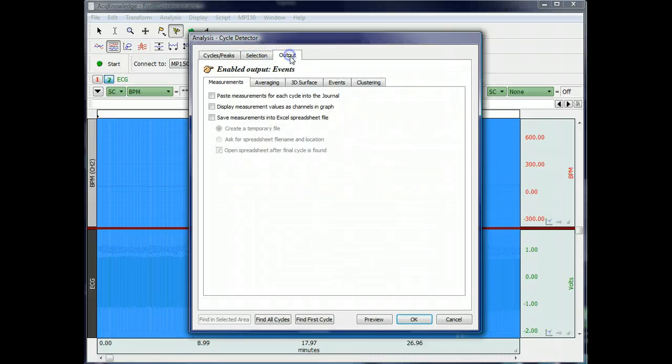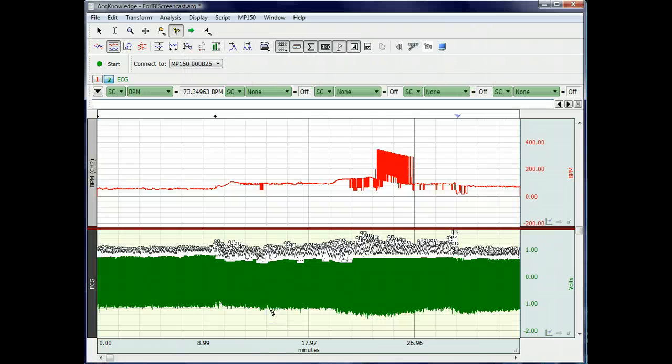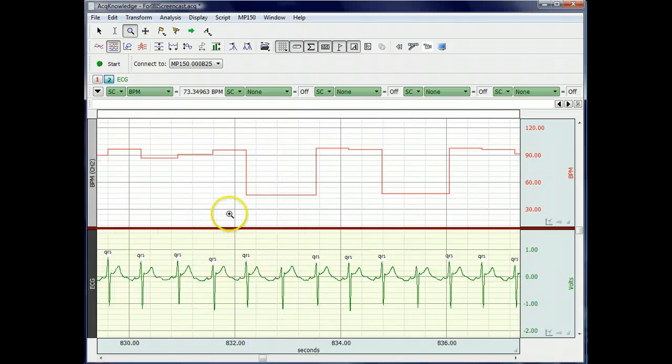Well, that looks good. Let's go back to displaying measurements. Okay. So you see it's still actually not so great, and now we have a whole bunch of places where we've missed them. In fact, we might even want to redo this section. Well, we'll see about that. First thing is first, let's zoom back in here.